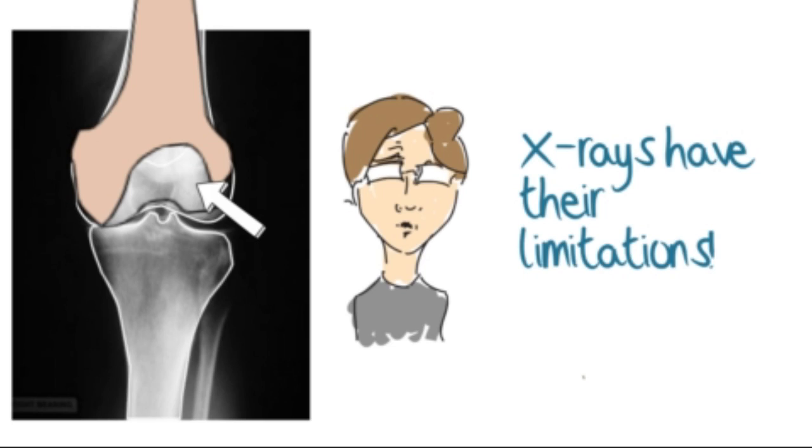So you can see from this that X-rays have certain limitations. One has to do a lot of interpretation to understand exactly what you are seeing. Therefore, one radiologist may give a slightly different report from another, depending upon his or her skill at interpreting minor subtleties in the shadows and highlights.